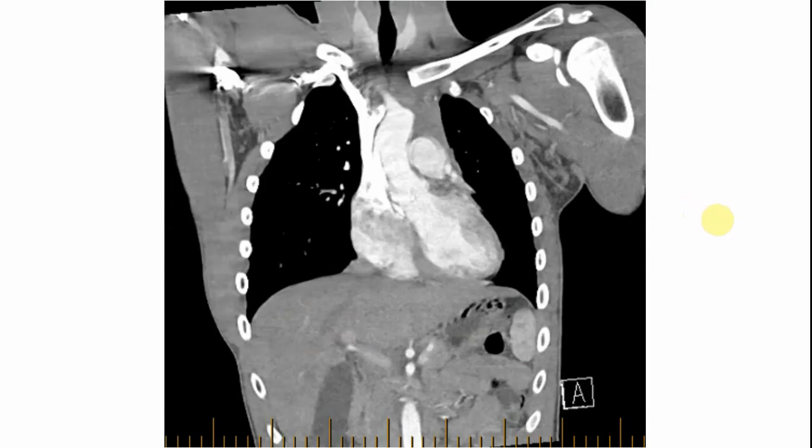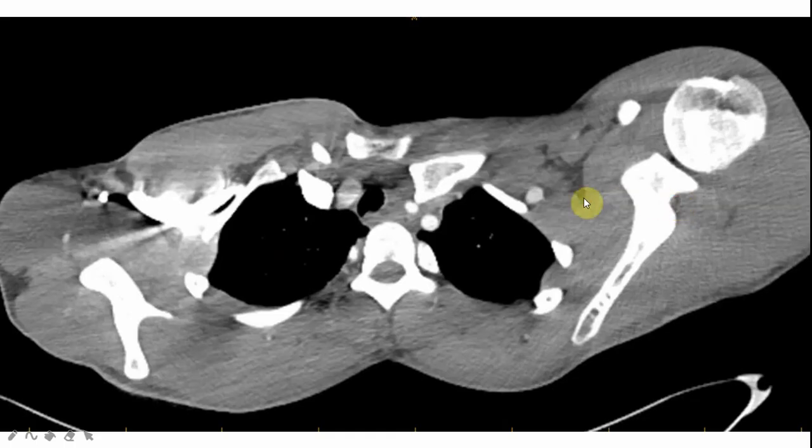And this is the coronal view. As you can see, the left clavicle, that looks beautiful. So this is once again the medial end of the clavicle, the lateral end of the clavicle, no fracture in the bone, no obvious soft tissue injuries I can see. This particular section does not show any airway problem, no breathing problem in the lungs, no circulation problem in the heart or the vessels. The most important view actually was the transverse section.